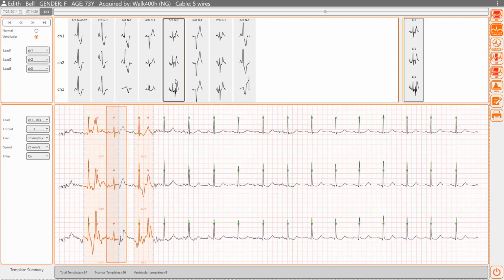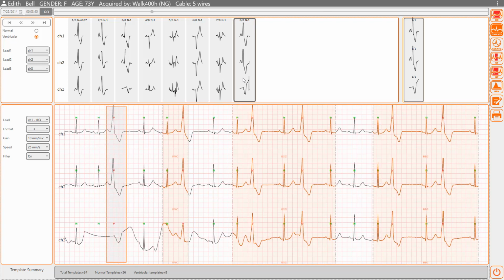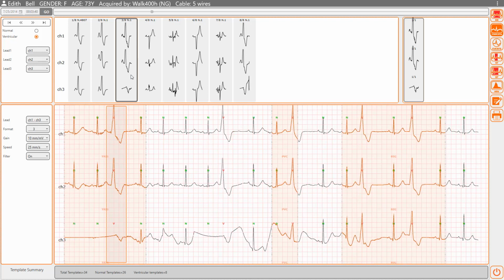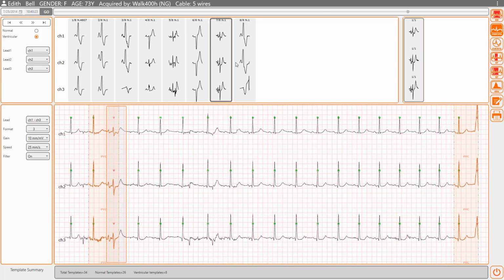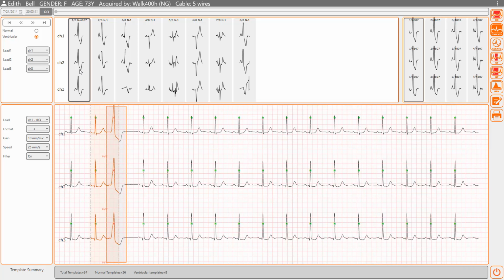So let's just complete the job. This is okay, this is okay, this is okay. I think I cleaned more or less. Okay, this, for example, is an artifact. This is not true. Okay, more or less I think I have completed my cleaning job. Anyway, later I can come back to here.